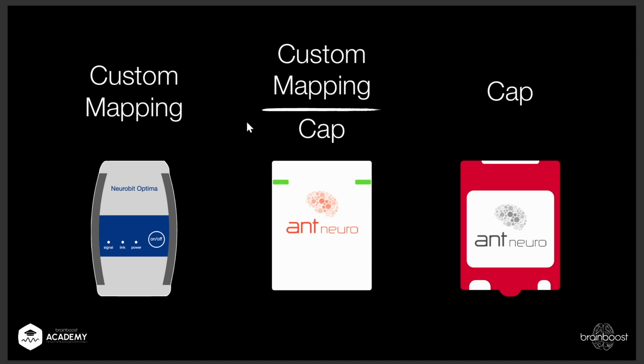With a device that has 2 or 4 channels, for example, to do an analysis, to create an auto report, you need to create a custom mapping. What does that mean? Where do I place electrodes? I will go into more depth on that topic.